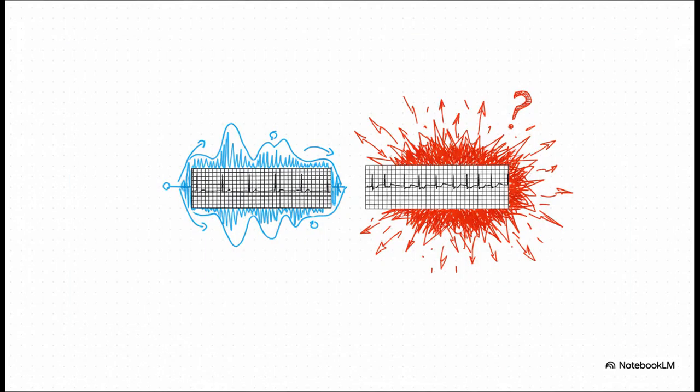Now, this is where things can get really messy. This is atrial fibrillation. The P waves, that orderly little squeeze of the atria, they've just disappeared. Instead, you get this chaotic, quivering baseline, and the rhythm becomes completely irregular and unpredictable. The story has totally lost its structure.